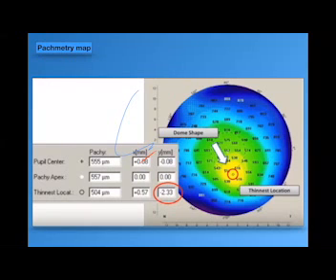Before going to the pachymetry map, in the elevation map, you will study the numbers and the sign of the numbers, plus or minus, and the correlation between the posterior and the anterior elevation with other figures. Also the appearance of the color code scale of this patient.